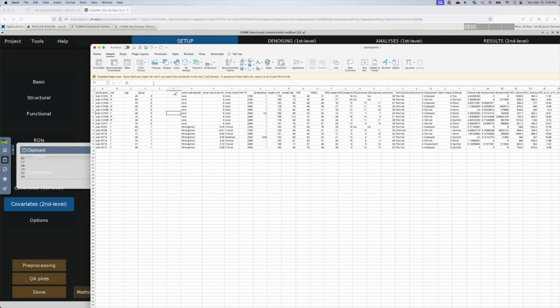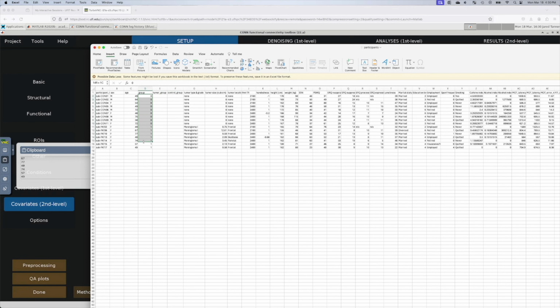And really I would only have to do one, but let's do it this way. So this one I'm going to call our tumor group, and we're going to call one control group. So what does tumor group look like? Tumor group is going to have a 1 if it is in the tumor group. So that's actually the same thing as group. That's why we don't really need to copy it, but I'm just doing it this way.